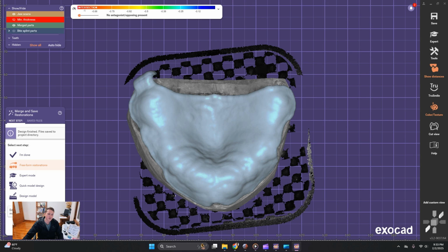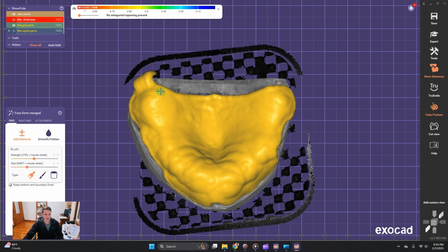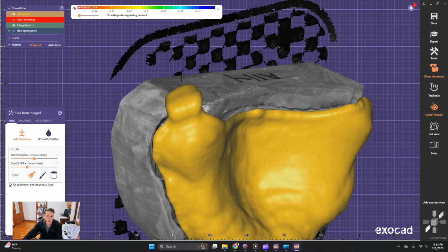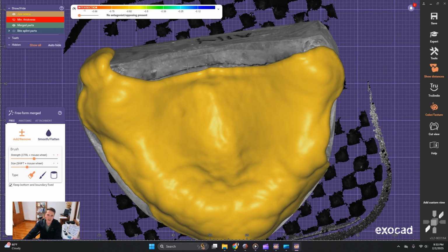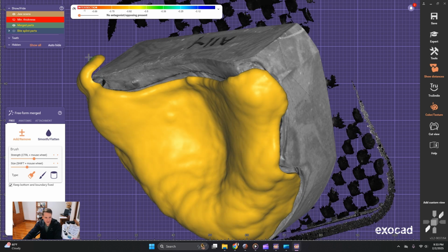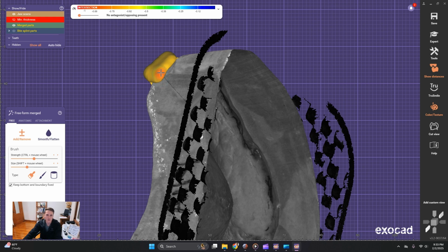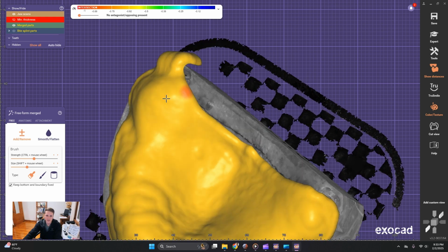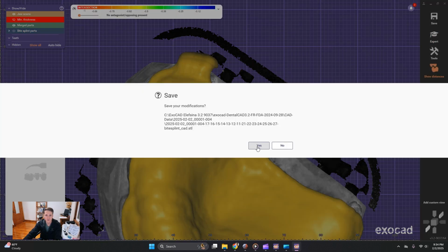So now I'm going to hit freeform restorations, and it's going to bring us back to right where we were. So I'm going to deselect that there and say that I want to bring this back. I wanted to just try and cut this, if maybe possible, if I sat here for a while and hit remove, and try to remove all this back. But the easy way to do it is I'm going to sneak in an expert mode real quick.